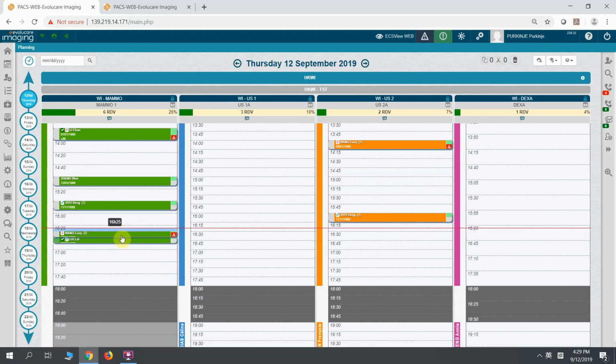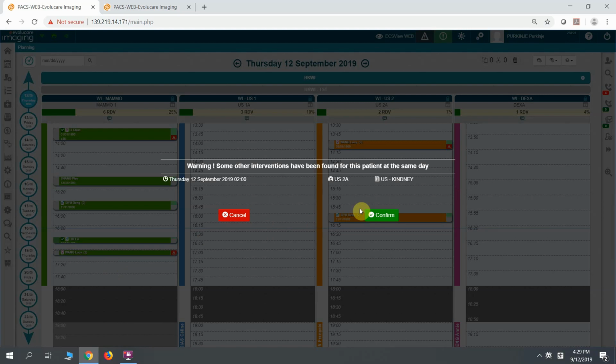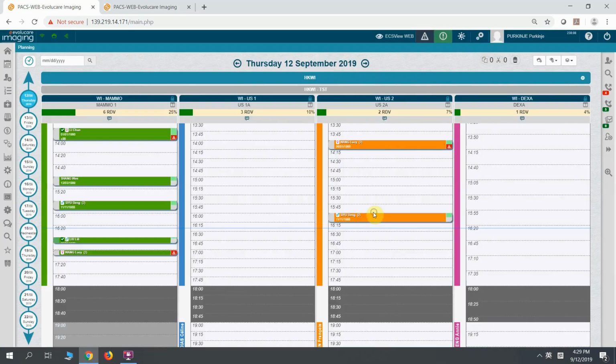Of course, if the patient changes his mind and says, okay, I want to change my appointment to after 5, I can simply join the job here. Same patient, in-patient, file patient. Confirm, because this patient already has an appointment for ultrasound. So it reminds you if you want to change the schedule or something.